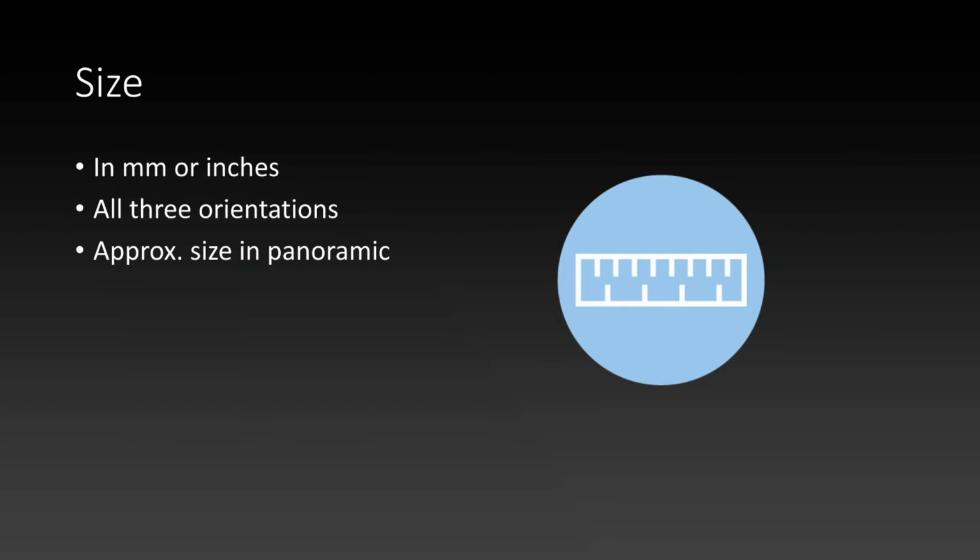Because panoramic radiographs are always magnified and somewhat distorted, just provide an approximate size on a panoramic radiograph, such as the lesion is as big as the crown of a molar, or the lesion extends from the area of the second molar to the area of the first premolar and extends from the crest to the inferior alveolar canal. Do not use terms such as large, small, or huge. These descriptive words may mean different things to different people.